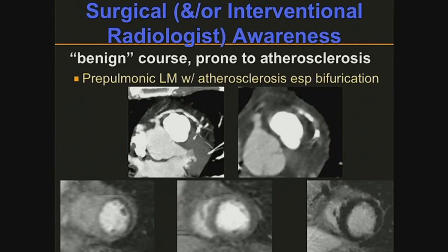Here's the perfusion part of the exam where you can see the anterior and the lateral wall here. On stress it shows hypoperfusion, which is a stark area. On rest, it reverses. And on delayed imaging, it shows that this is not infarcted. The only infarcted part was this little small area here. So this patient has ischemia.